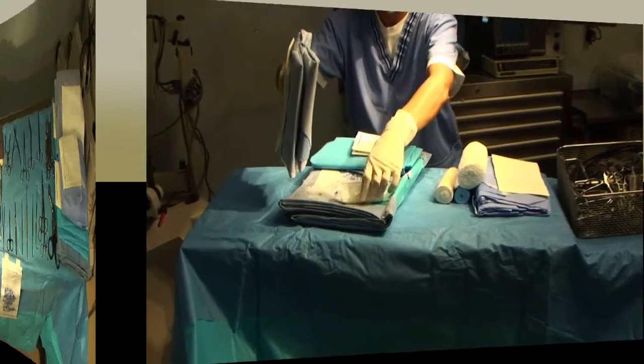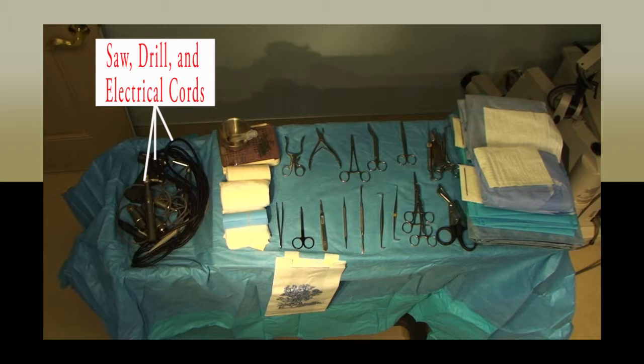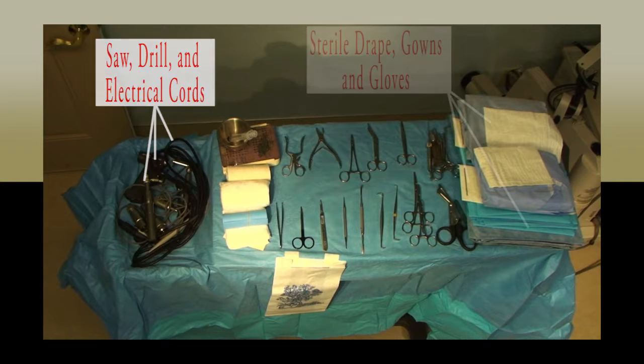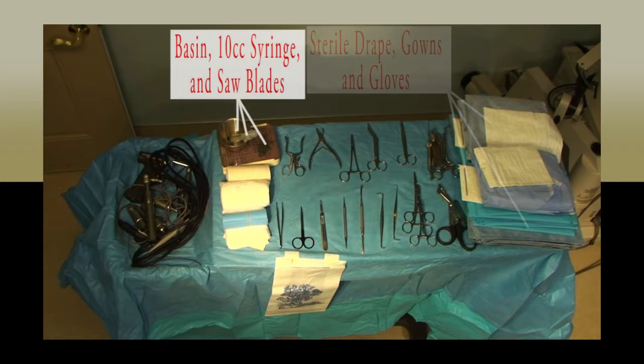Initially, all bandaging cloth items should go on the left side of the field, and all instruments to the right. You will set the saw and drill on the field and place the electrical cords on top of them. Place the sterile drape and surgeon and scrub gowns along with gloves. In the upper left corner, place the saline basin and 10cc syringe in it. You will also place all 3 saw blades next to the basin in the upper left corner.